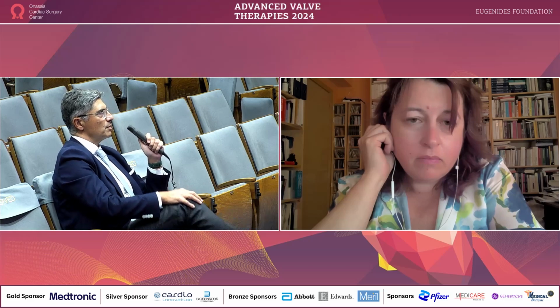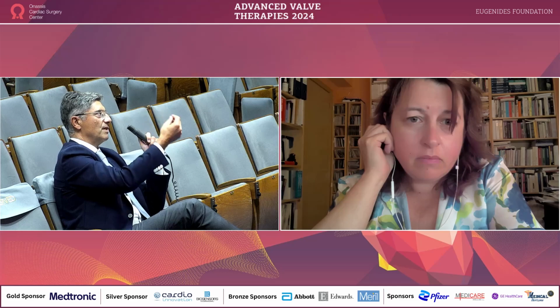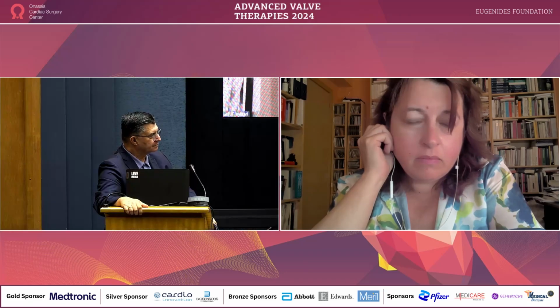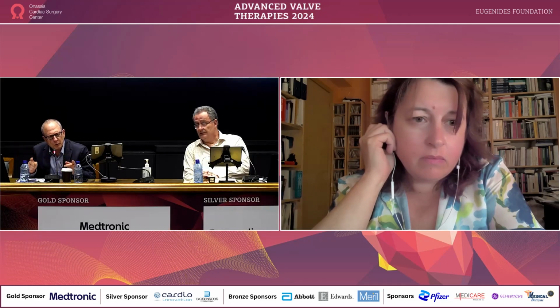So we were planning to do a paravalvular leak closure based on the TOE findings. Yeah, so this is really interesting. John, my question is whether the angulation that they are giving you, because you are giving angulation, is that right? The appropriate angulation to approach aortic paravalvular leak, for example. You do give them. Of course. Yes. Do they correspond to what you're actually getting in the cath lab?